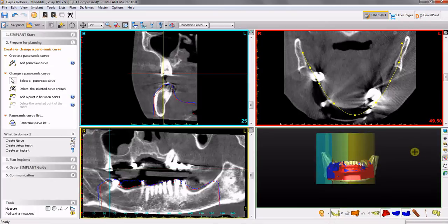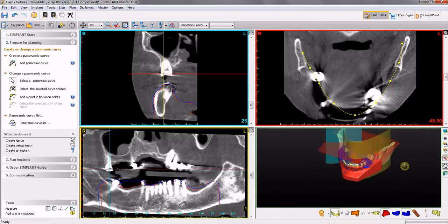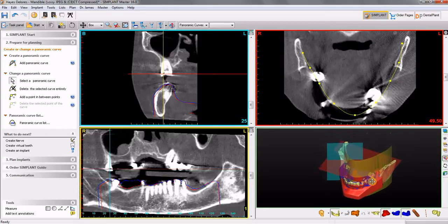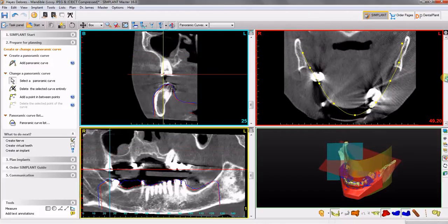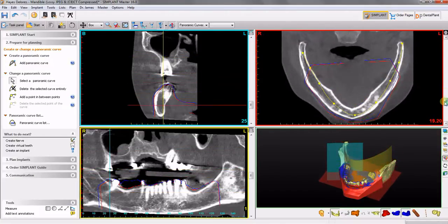Now, by clicking this, and we'll be able to rotate this, we can now in real time see what those 3 2D screens represent. So the first one is the axial plane in red. Now you can see that all 3 planes here are color coded, so it makes it easier to see in the 3D what the plane is doing.